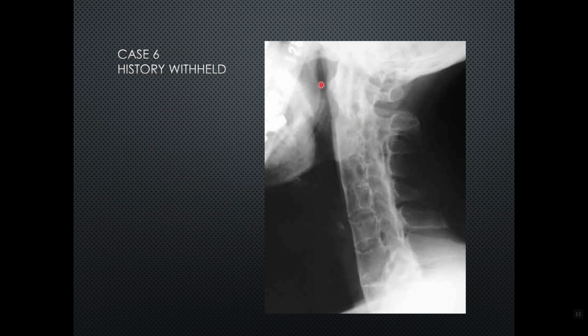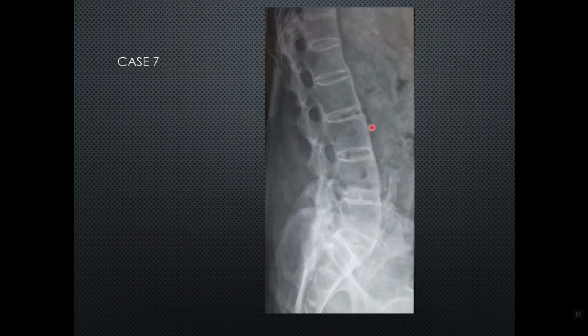So, radiographic of the cervical spine with flex and extended views. And of course, we know that any kind of manipulation to that spine is highly contraindicated. In this case, another significant feature of AS: you can see those marginal syndesmophyte formation. You can see some intervertebral disc calcification, squaring of the vertebral body, and you can see fusion of the facets. So all this without skip areas, highly indicative.